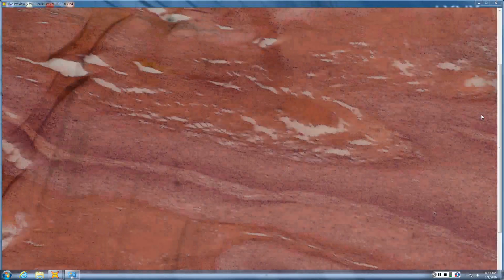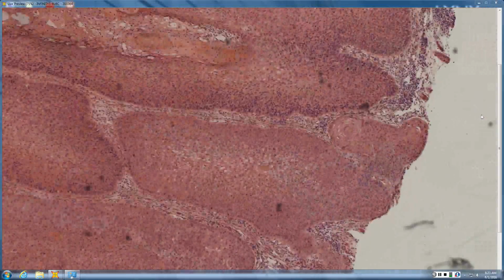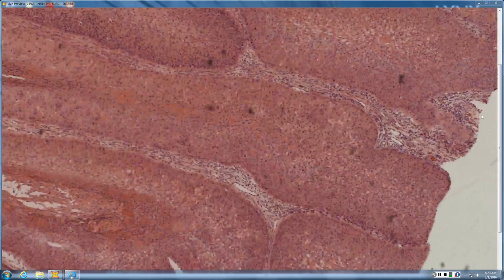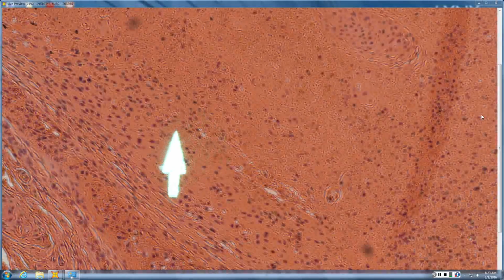So, I mean, it's hard to tell if it's invasive because we're not seeing the base. So could the whole thing just be Bowen's with massively enlarged rete, or massively enlarged follicular epithelium? And it could be. So you're absolutely right. You don't know that this is invasive going to the base. But it's probably a papillomavirus-induced Bowen's. It has retained its round parakeratosis like a wart, whereas things like AKs have flat parakeratosis. This has round like a wart.